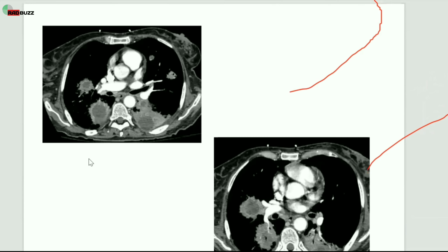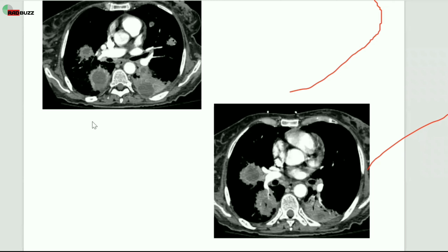Whenever there are multiple abscesses with central necrosis, there will be a differential possibility, because patients with septic emboli, vasculitis granulomatosis, and squamous cell carcinoma have various types of dirty cavity-containing lesions and air-fluid levels. So these are centrally necrotic, fluid-containing, debris-containing lesions in both lungs with surrounding areas of consolidation. So the history will tell how much it is, like less than 6 weeks acute or chronic, and how septic the patient is.